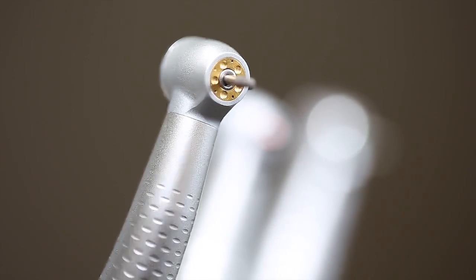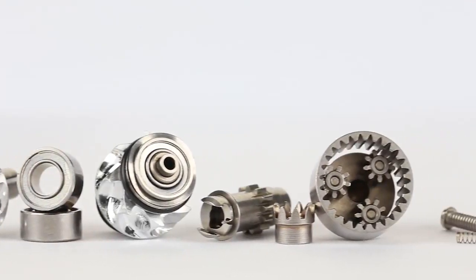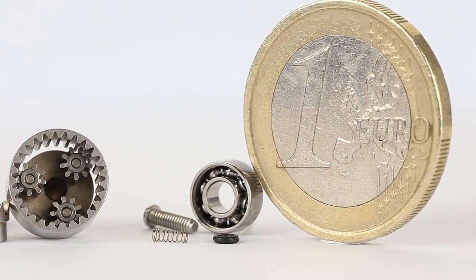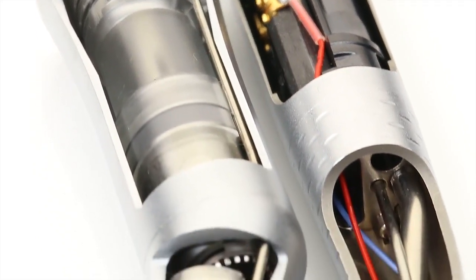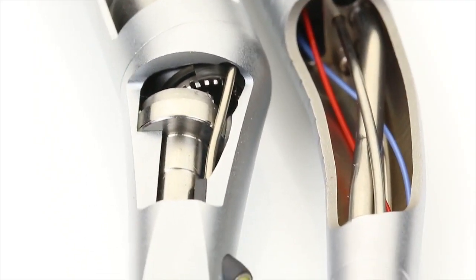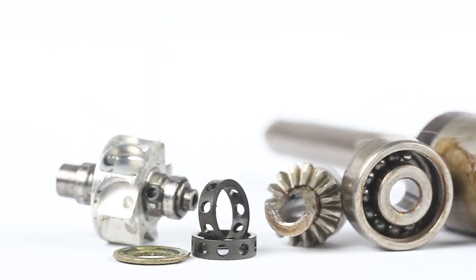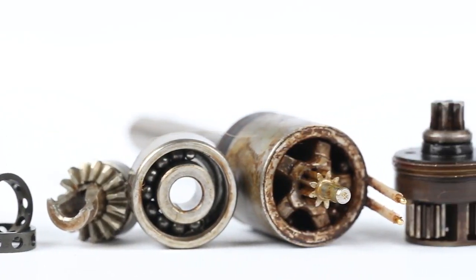Turbine handpieces and straight and contra-angle handpieces are precision instruments, which have to resist extreme pressures, not only during handling, but also through the hygiene and maintenance process required. Inside these instruments, there are high-precision ball bearings, gears, fiber optics and bulbs, electronics, air and water filters, and seals, which can only work properly if they are cleaned and maintained correctly and regularly. Insufficient lubrication also leads to a faster wear of the rotating parts.